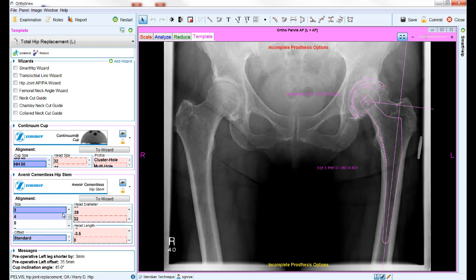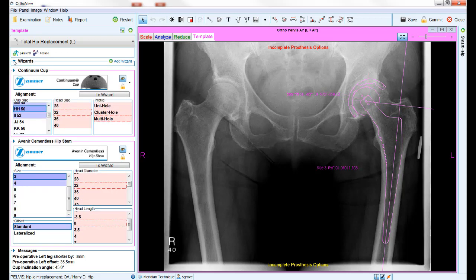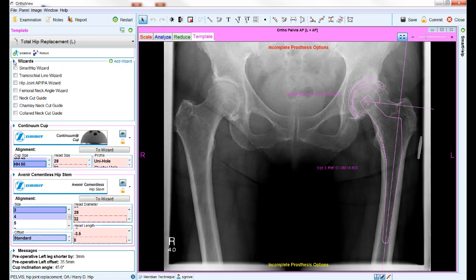Your template choices with all the appropriate sizes and options appear on the left hand side of the screen. If you are using a small or low resolution monitor, these panels may be small and difficult to see. If this is the case, the blue triangles on the corners of each section allow you to minimize and maximize individual portions, allowing more space for the other areas.